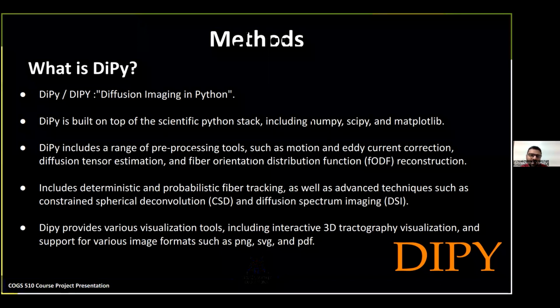And as I mentioned previously, DiPy also has a lot of deterministic and probabilistic fiber tracking algorithms and some newer algorithms like constrained spherical deconvolution and diffusion spectrum imaging.